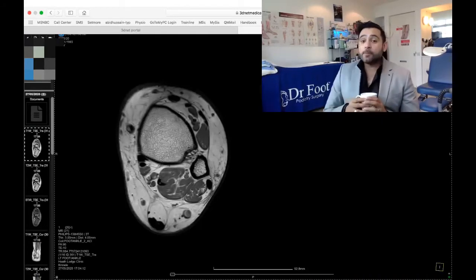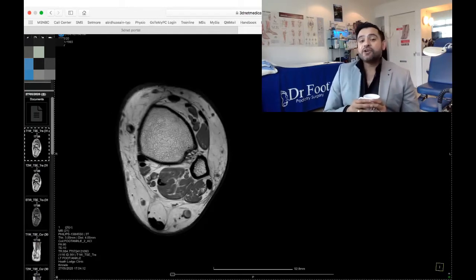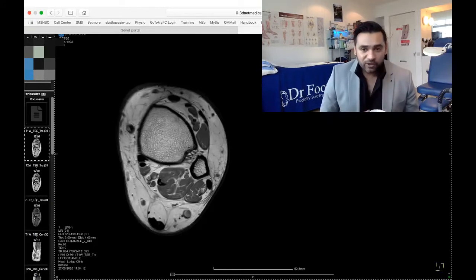Following on from the previous video I did regarding the MRI of the knee, I've been asked by a couple of my colleagues to make a video regarding the interpretation of ankle MRIs. So we are here. We are going to make a video regarding MRI ankle interpretation.